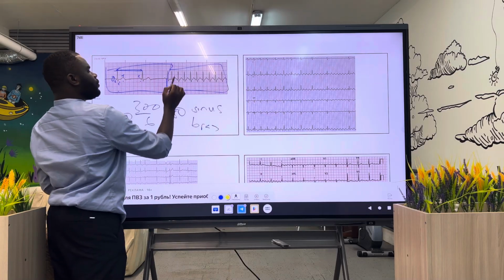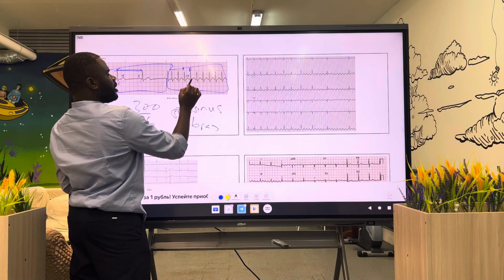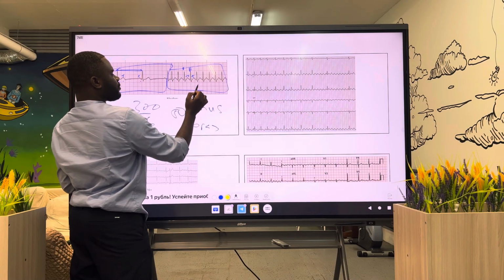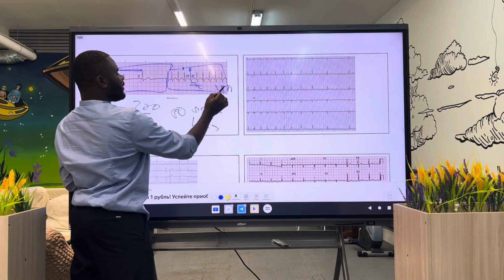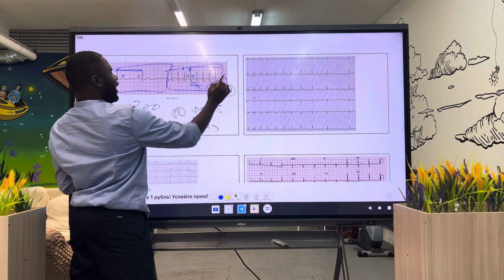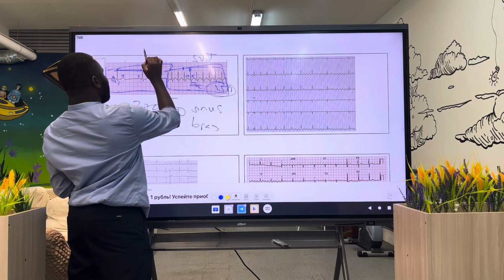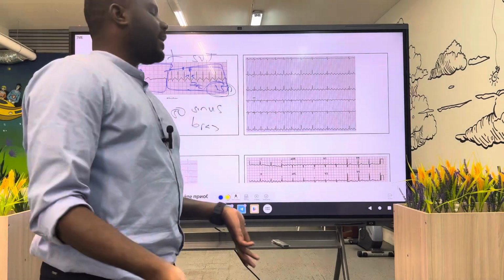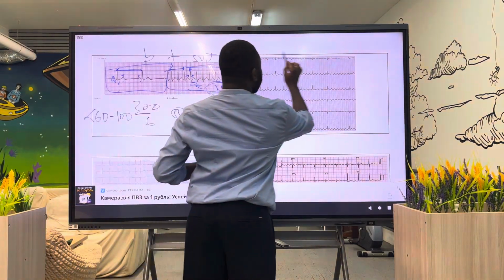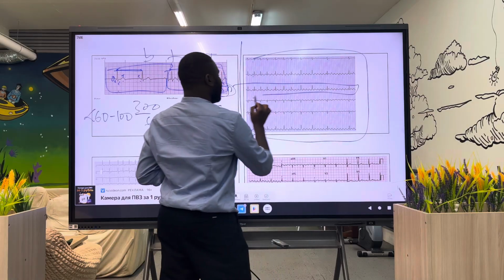Here we have a very wonderful case. We have a T wave in between RR intervals, right? Just a T wave, and it is very fast. So here we have 2. So 300 divided by 2, we have 150 here, right? 150. So here it's non-sinus and regular. So this is known as SVT. And then here we have bradycardia. So we still have paroxysmal what? SVT, regardless. So this is a beautiful ECG from a patient. If you look at it, we take out this one here. You understand?